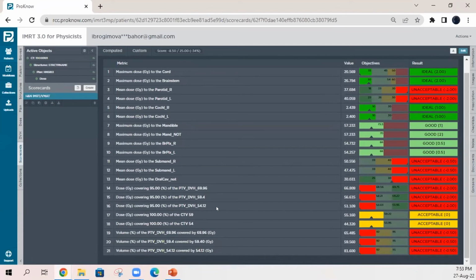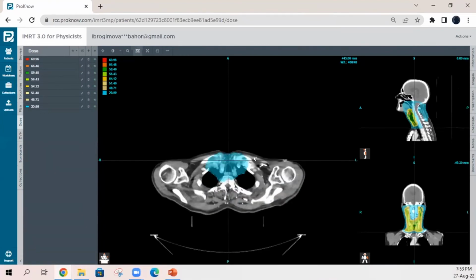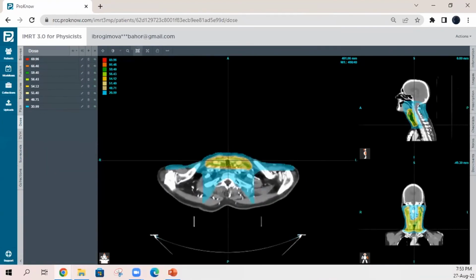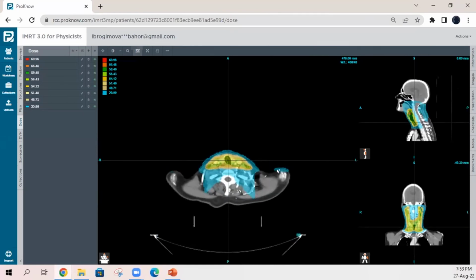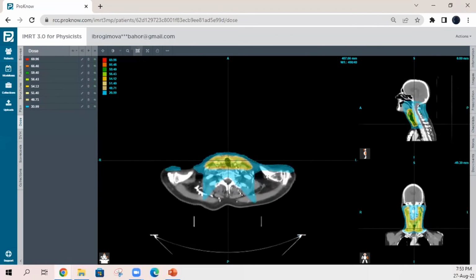He spent a lot of time working with the DVH itself, and he achieved the constraints, but he did not achieve the constraints for either the PTVs or the organ risk. And if you go to the DVH or even the dosage itself, you see the dose split all over, and he's going through the shoulders. And we informed them, please try to avoid the shoulders. So this will be rated for unnecessary dose for no reason.